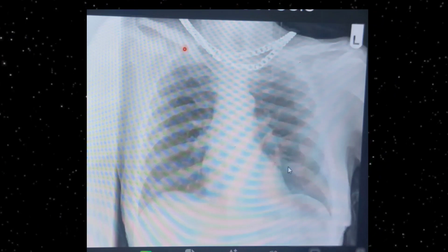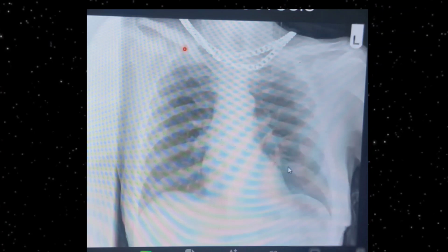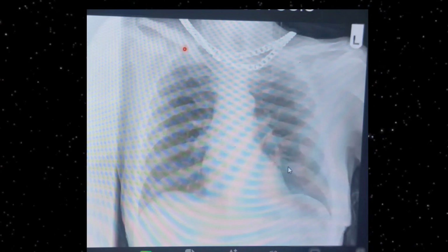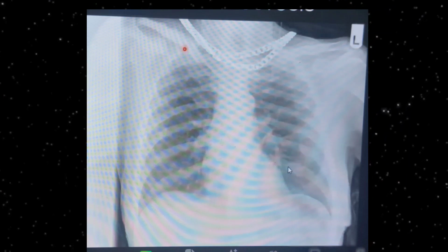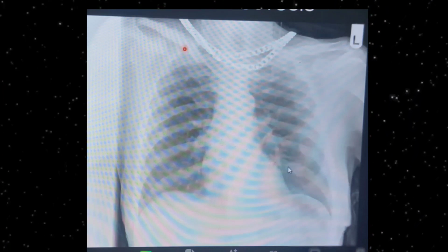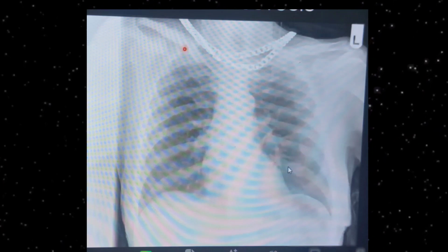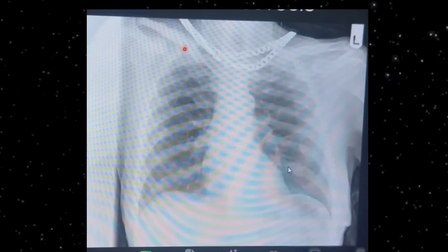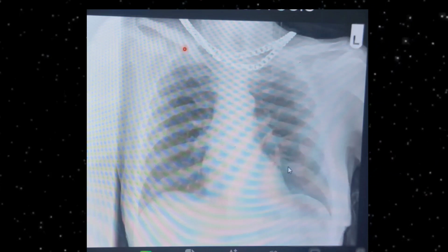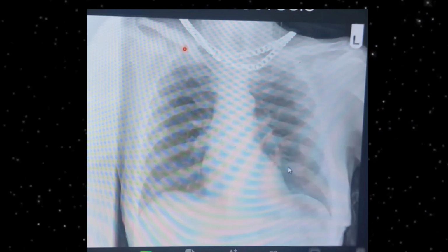This is a chest radiograph with a presentation of Melorheostosis, hyperostosis and sclerosis. However, the radiograph quality is not that clear, so you cannot easily pick out the points on it. But as far as the clavicles are concerned, they appear to be hyperostotic and sclerotic as well. So this was all about Melorheostosis, and I'm sure you will be able to appreciate these findings on radiographs.